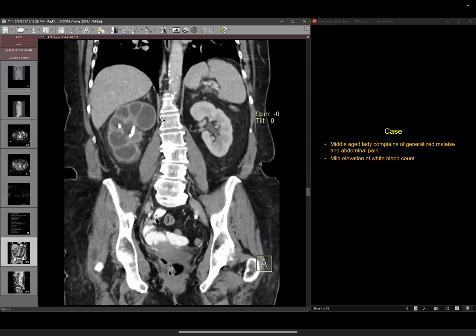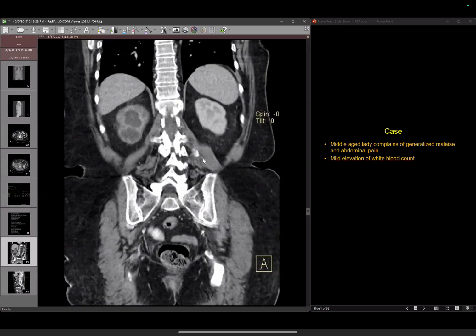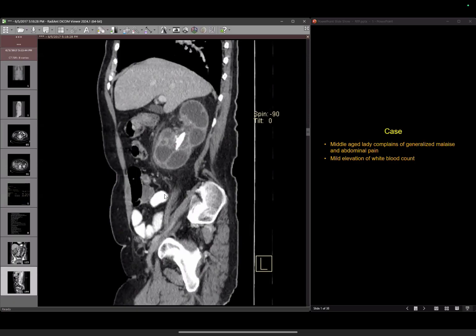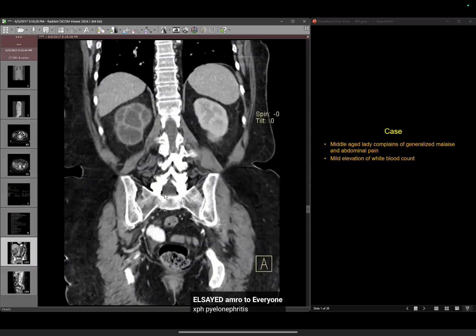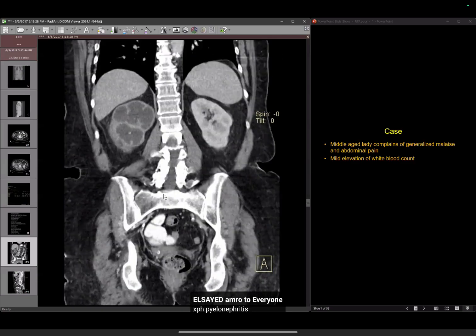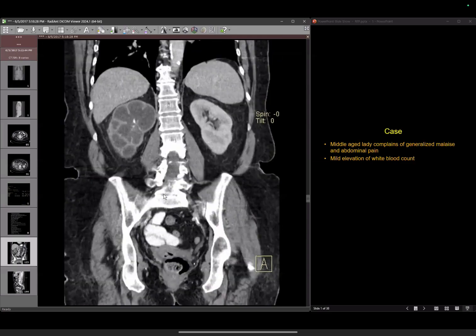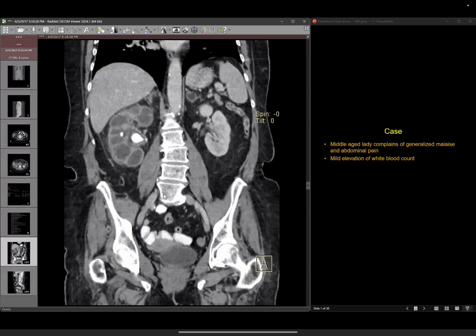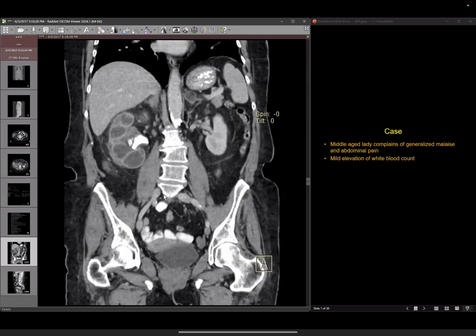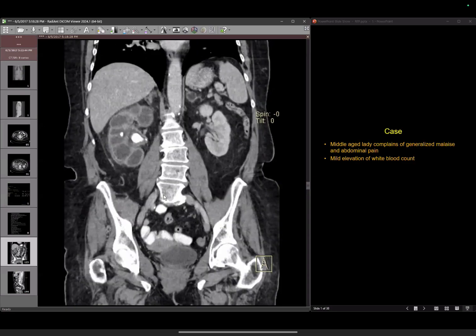So what do you think, Kusum and Lakshmi? Sir, I've been provided with the axial and coronal CT images. So I can see the right kidney. There is moderate to gross amount of hydronephrosis there, along with perinephric fat stranding. Yeah, go ahead. That's also there, excellent. There is a presence of calculus noted in the right renal pelvis, staghorn like maybe calculus.